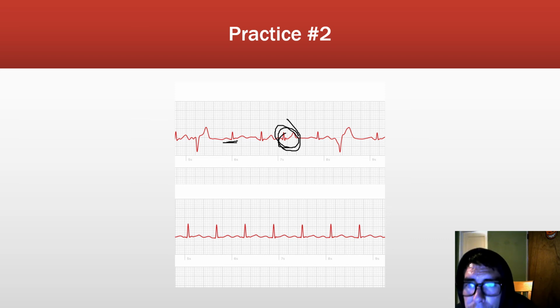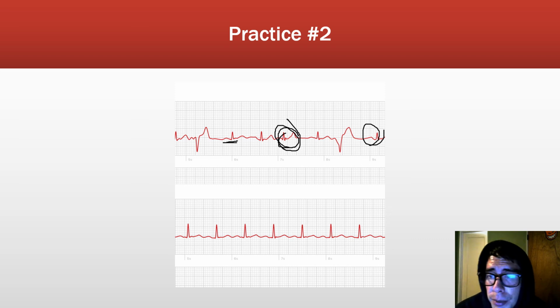But we know we have 2 ectopic beats, and they do come early, it looks like, instead of being way down by these ones. So that would mean it's an irritability thing, so it would also be known as a premature complex, as we call it. And we'll get to that in later lessons. But with this short of a tracing, no way to determine if it's regular or not.